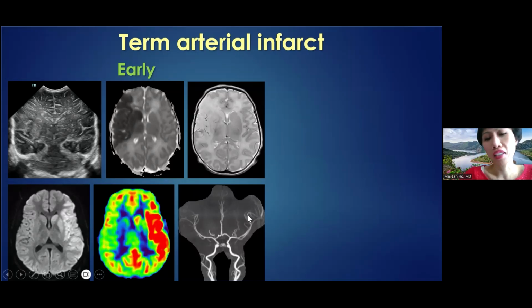Interestingly, we usually don't find a clot, right? Like there's nothing for neuro IR to do. The theory is that maybe there's some placental emboli, they kind of flicked off and occluded, and then they kind of cleared out. So we usually don't find the actual clot, but you see there's restricted diffusion, but on the ASL, there's actually a luxury perfusion, and that MCA is actually more hyperemic. So again, that's that secondary energy failure. That's flooding the area with free radicals and causing additional injury on top of the original ischemia.